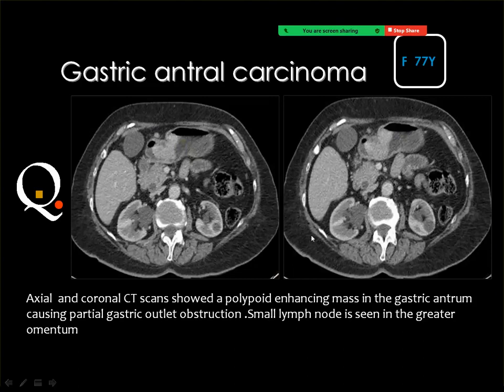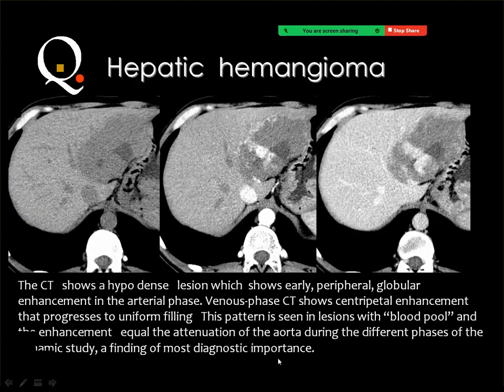This is one of the drawbacks of this arterial phase imaging, where you cannot see the parenchyma of the kidney. You see only the cortex, and the pyramids are not yet stained with contrast material. So this is a parapelvic simple cyst. It is not a dilated renal pelvis.